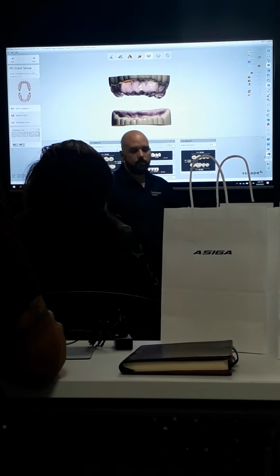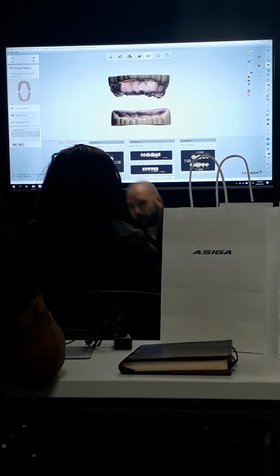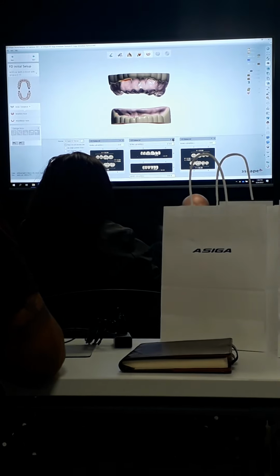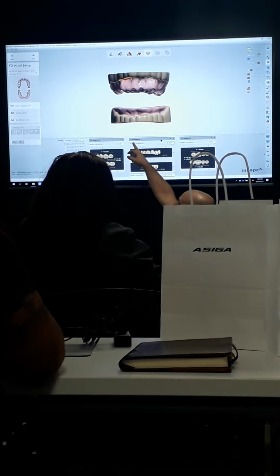So typically you'll want to see the full view when you're picking the libraries. And then after that, I just minimize the whole thing so that I have the full design space. Most of the libraries are going to be labeled up here at the top as to what type they are.